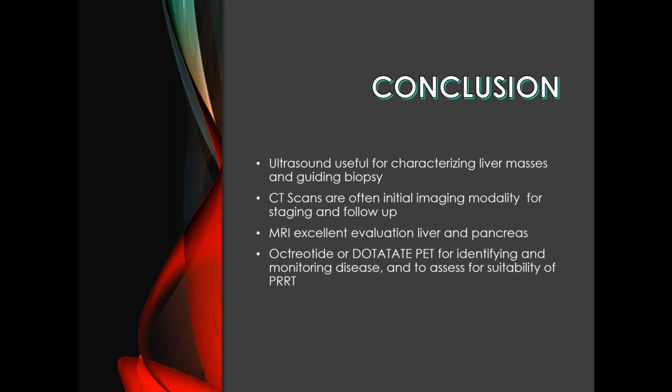The thing is that you have the added ability to be more specific with the DOTA-TATE, because if there's DOTA-TATE uptake, you can be pretty confident it's probably metastasis, keeping in mind some bone lesions that are not metastasis will also have DOTA-TATE uptake, but then again, they will correlate everything. So you could go with MRI or DOTA-TATE PET or even Octreotide PET as follow-up. Again, it depends on the size of the lesion, but those are probably more accurate than CT.